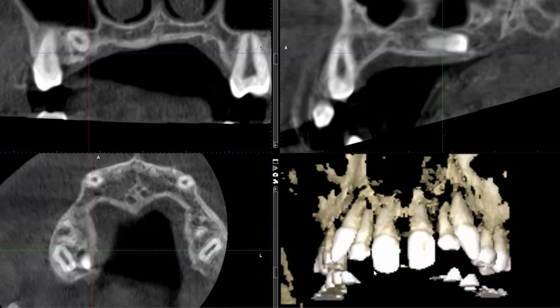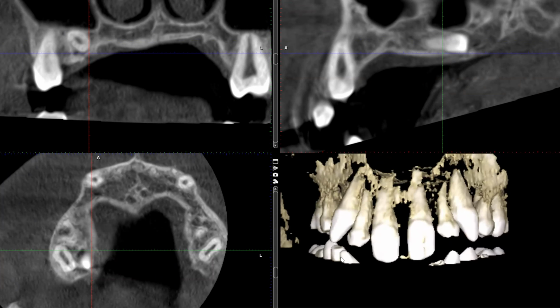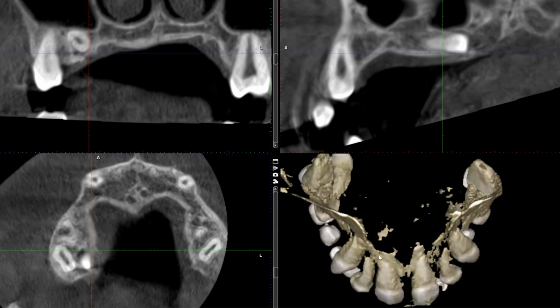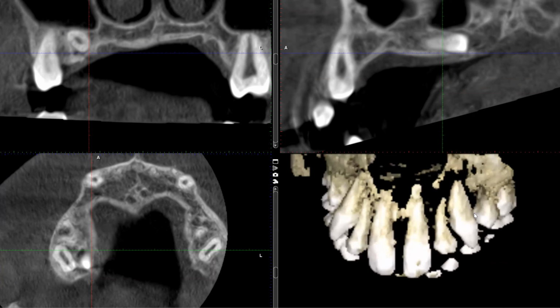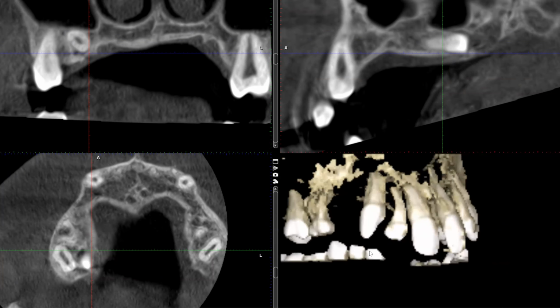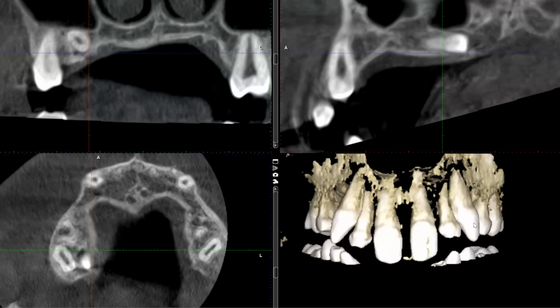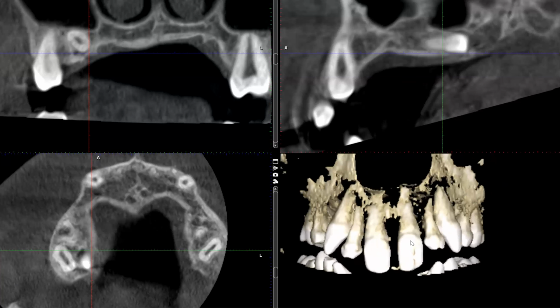And these features are also seen in the mandibular dentition, but we did not capture the mandibular arch for the sake of reducing radiation dose, as this was taken primarily to visualize the impacted premolar, but we were able to extend it just laterally enough to capture the contralateral side. So these are very conical, right? And that was also true, if I recall, in the mandibular arch as well. And that's a very helpful feature for diagnosing the patient's condition.